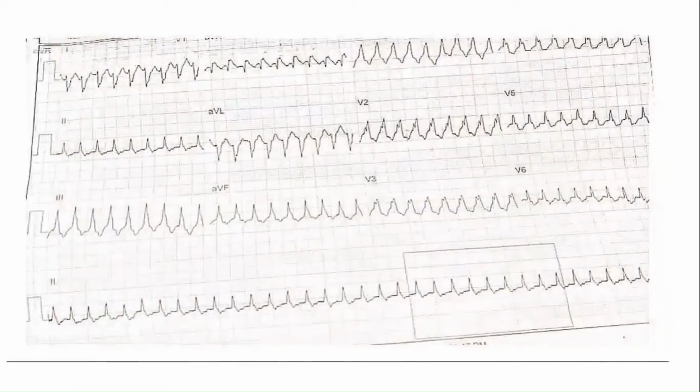So this is the last ECG. It's again a very interesting ECG, and a very good learning ECG. This is a tachycardia. Anybody can comment. So anybody who would like to comment on this ECG? My question is, is it VT? Anybody who is in favor of VT? Or VT is not likely in this case? Is it VT or no VT?